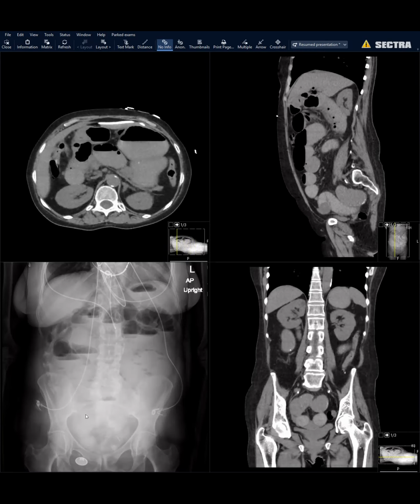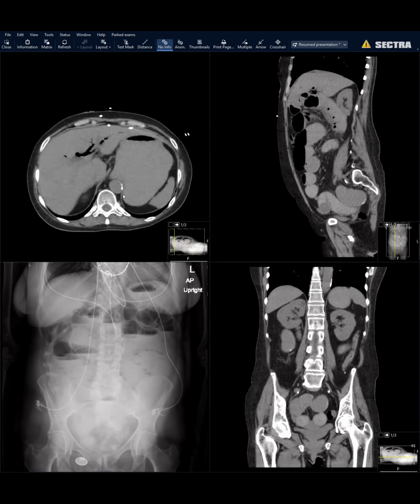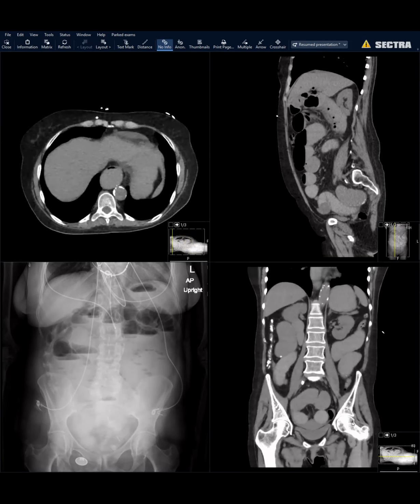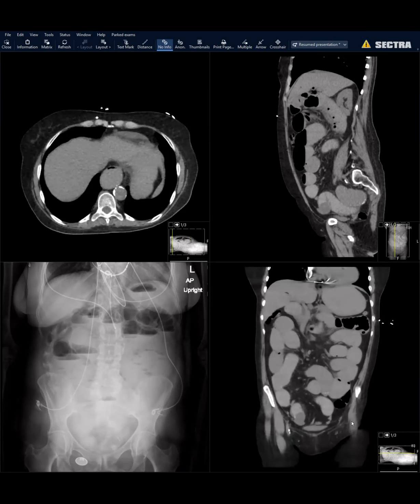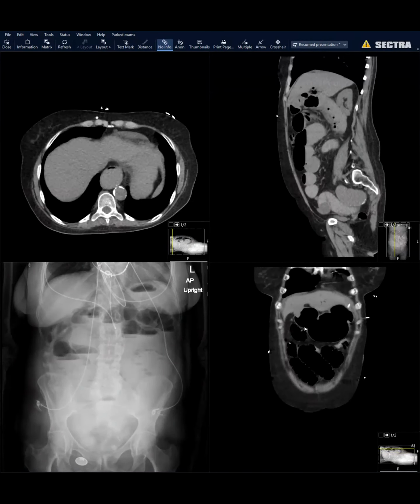I wish the stone were radio opaque like they show in the boards on the scout, right? This was radiolucent. But again, going back to looking at bowel on coronals, I think it stands out really nicely on coronal images, and the pneumobilia also. So those were my quick cases.